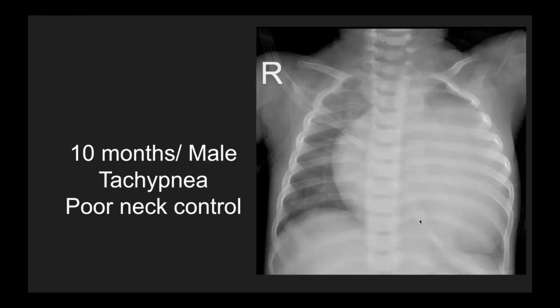The next mode of action, what should we do? We should do a bedside echocardiography. And for that, we don't need to wait for the cardiologist to come. We can simply put our probe for a focused look, and we can see what is actually happening here. So a cardiac cause is definitely on the cards over here.